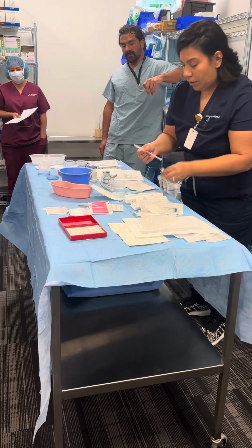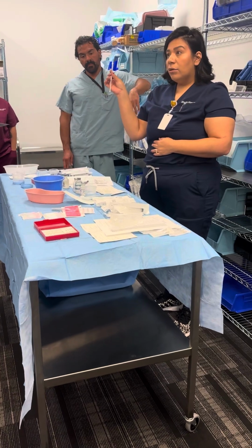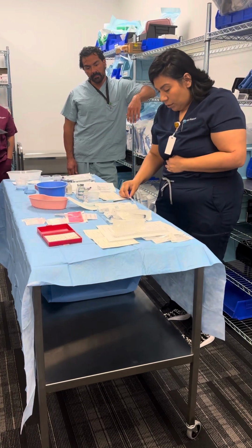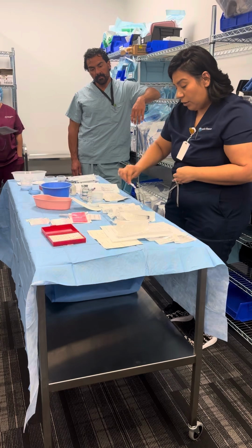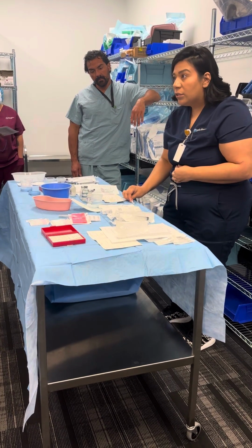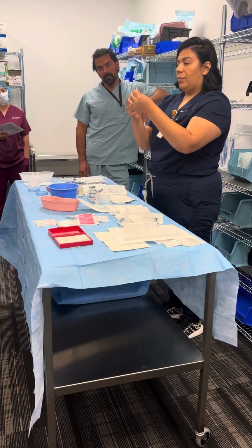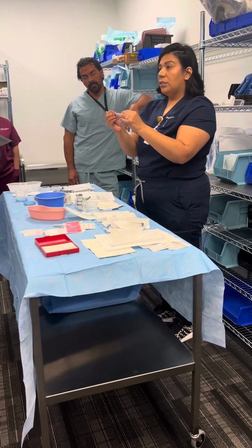Okay, so I'm gonna recap this. When you recap any needle, you're using one hand, okay? You're not using 2 hands. So if it's easier for you, put your hand across your stomach and recap like this. It's always easier if you recap going straight and not at an angle. So parallel to the table, you can touch the table, it is not contaminated, okay? There, up, press down.